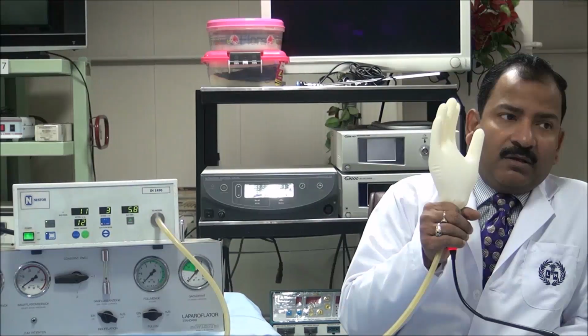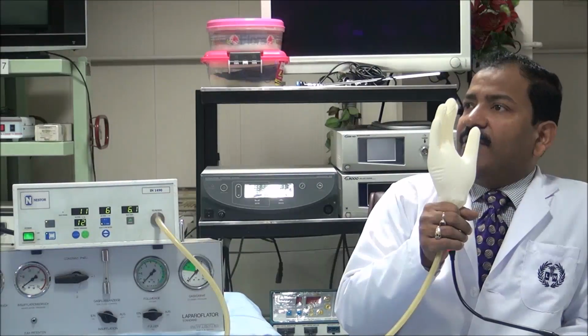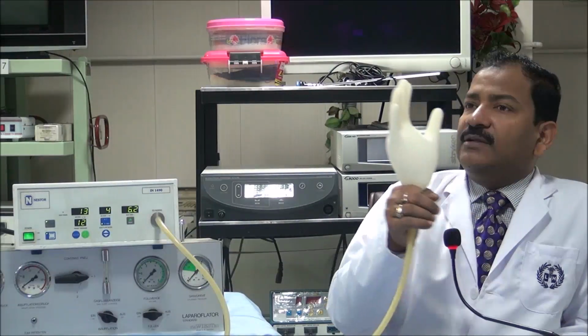Now more. 2, 3, 4, 5. Increase it. And if I close it, it will stop. And if pressure is achieved, it is 0. And if pressure is more, it will take the gas back.